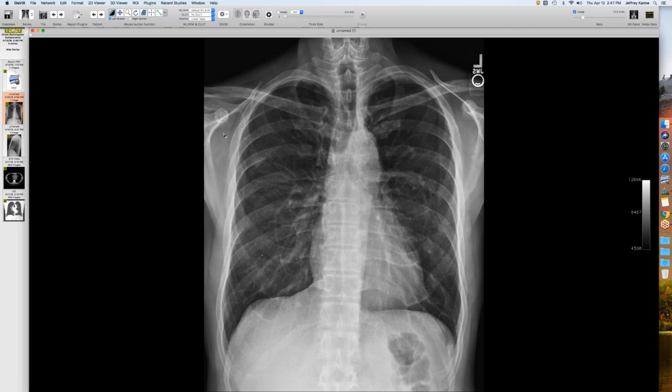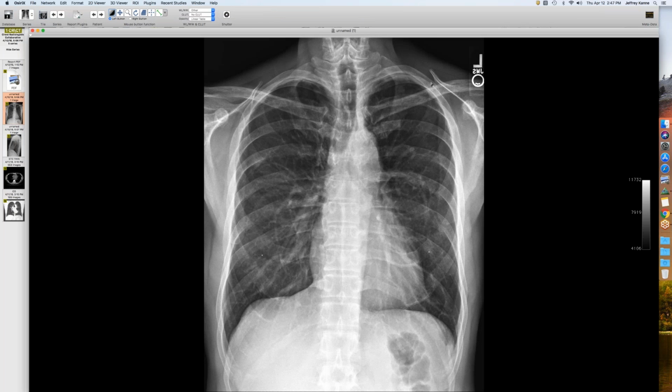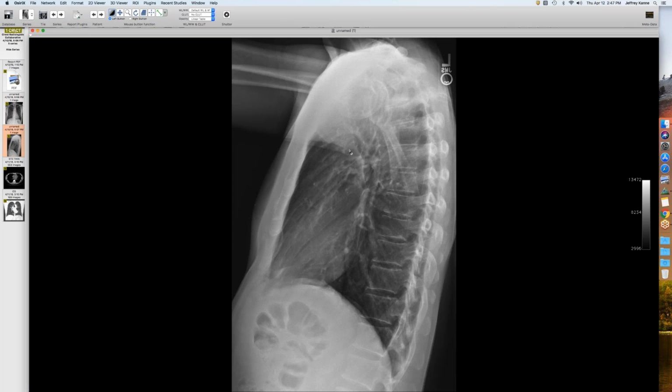So this one's for you, David, per your proto case from the previous week. This radiograph was interpreted as a possible nodule here in the right lung. I don't know this patient. I don't know if they were from the U.S. or not, but had a name that suggested they might not have been born here. And so, of course, we might think of TB or something. I think it was a non-smoker, but a questionable nodule here. And on the lateral view, you'll see this was actually circled. Someone had annotated the image, marking this area here.